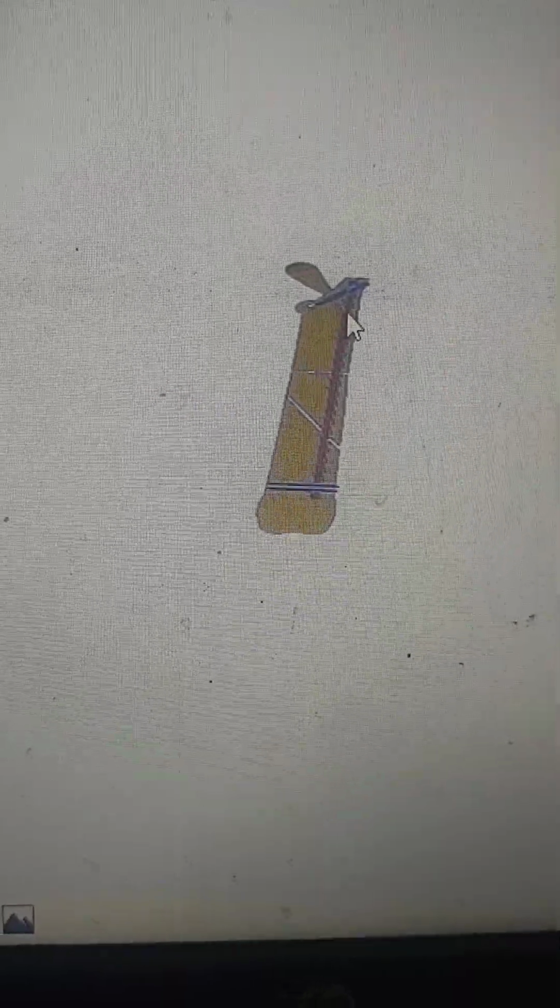You can see my mouse. This is for the screws, two holes. Okay, yes, this is the final image, and you can see the red rod here. This will save the femur bone, and these two screws will tighten here, and one screw at the bottom of the hip bone will tighten here.